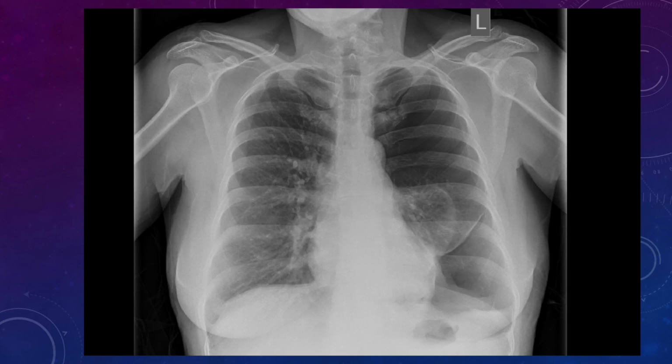Yeah, so we've got left side. Look how nicely we see the lungs. If only we could see the lungs as clearly in normal life, it would be fine. But okay, left-sided pneumothorax. Collapse the lung if you want a good view of the ribs. Always helpful. But yeah, okay.